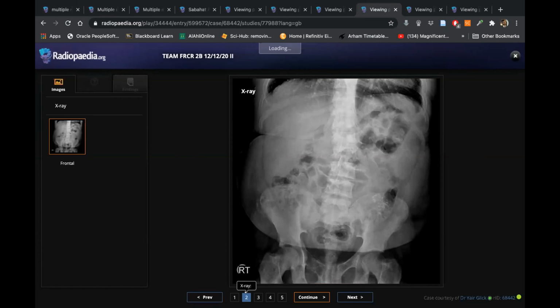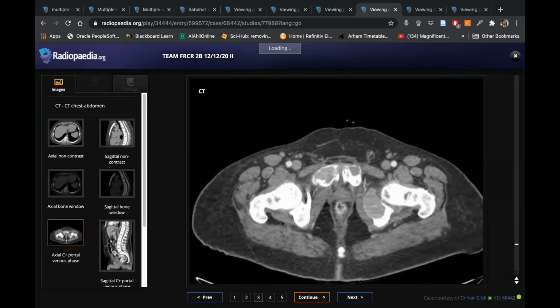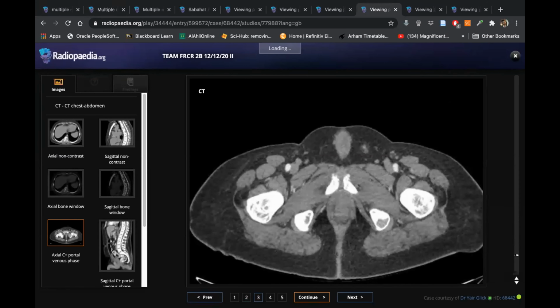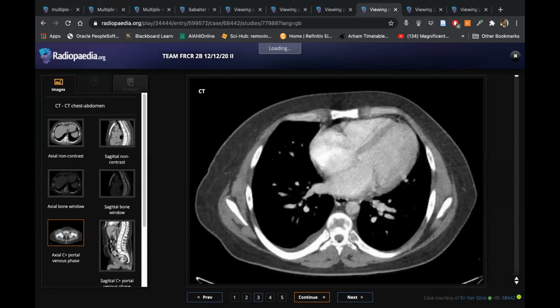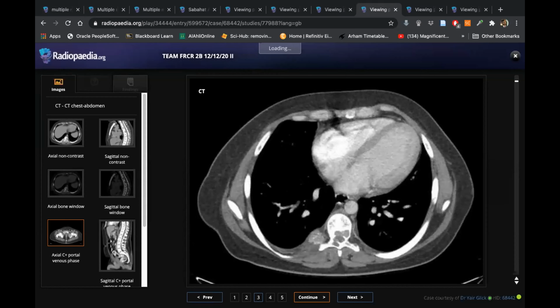Okay, I'm giving you a CT chest now. Which one would you like to see? There are so many. Okay, the venous phase. The venous phase. Okay, this is, let me take you up first. You're doing great, Dr. Kamal. Don't worry. This is the hot seat. Whoever sits here and does the job is a hero.